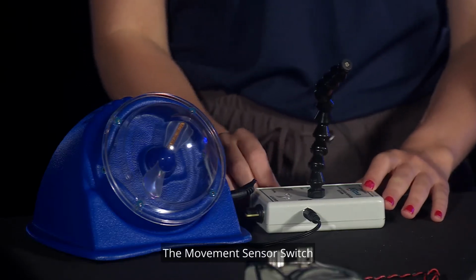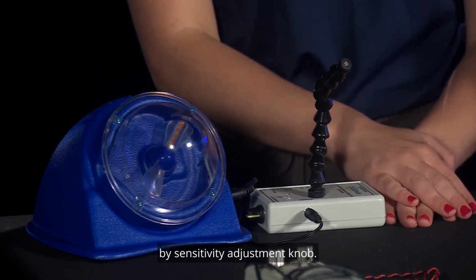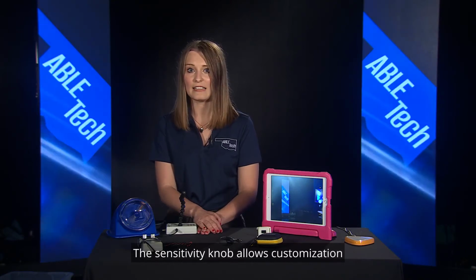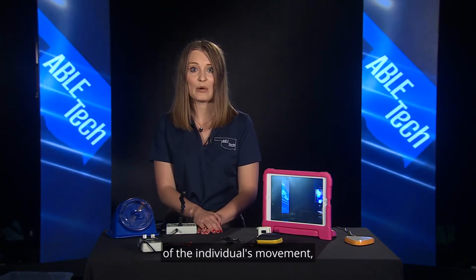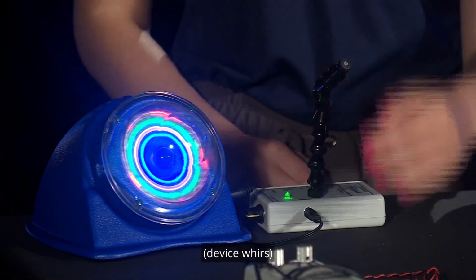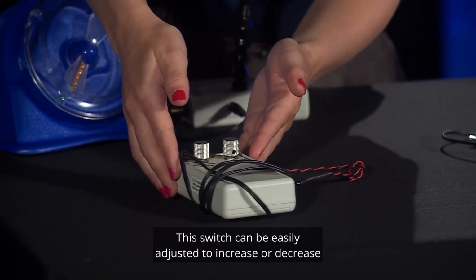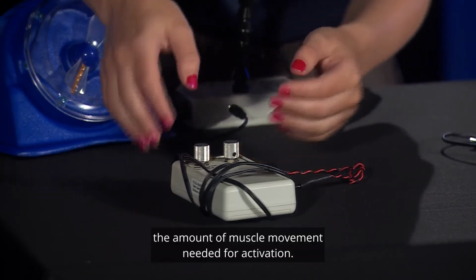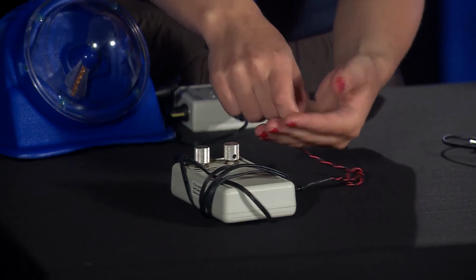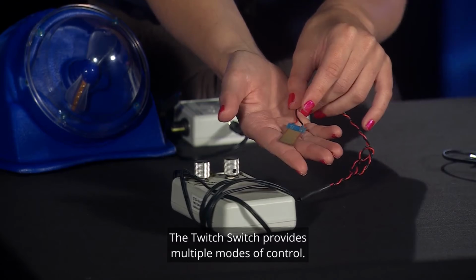The movement sensor switch features an adjustable sensor controlled by a sensitivity adjustment knob. The sensitivity knob allows customization of the individual's movement, whether minimal or exaggerated. The twitch switch allows access by slight muscle movement. This switch can be easily adjusted to increase or decrease the amount of muscle movement needed for activation. The twitch switch provides multiple modes of control.